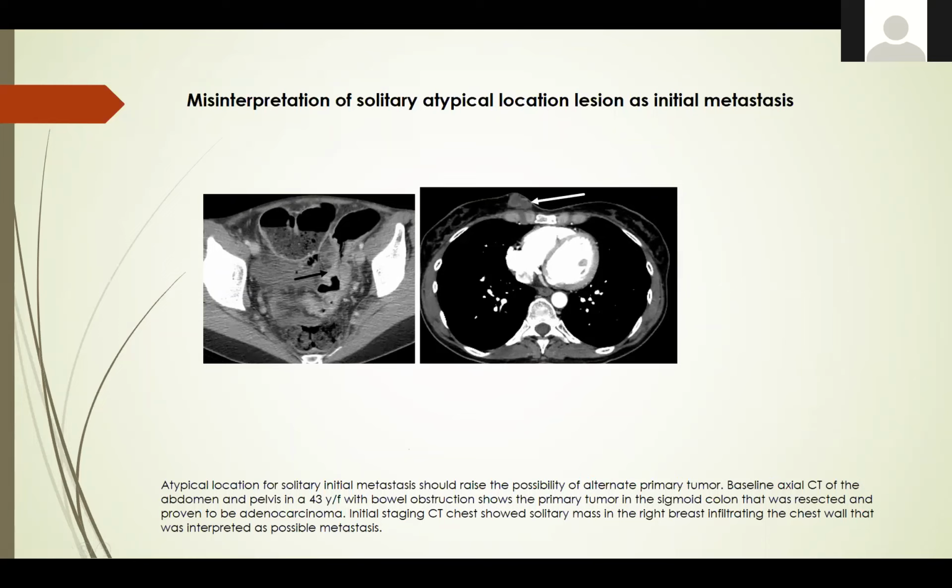So this was called as metastasis, but understanding that rectosigmoid colon cancer first goes to the liver, or sometimes, if it is lower rectal cancer, it can go to the lungs. Without seeing either of these, this is kind of atypical, and questioning that it's an atypical location would have prompted biopsy. The patient had a biopsy anyway, and this was a melanoma. So at least the radiologist would have scored some brownie points if we had called it atypical.